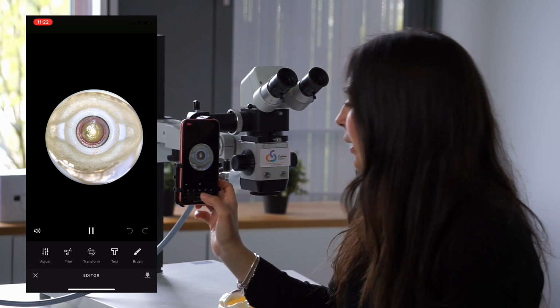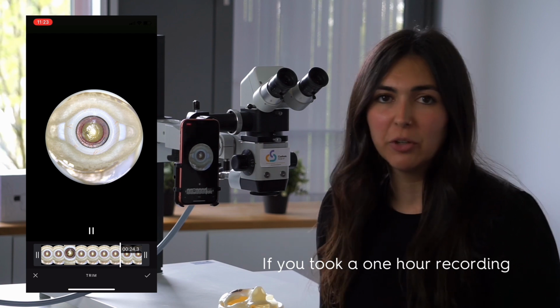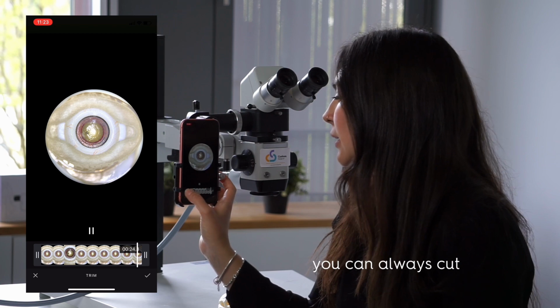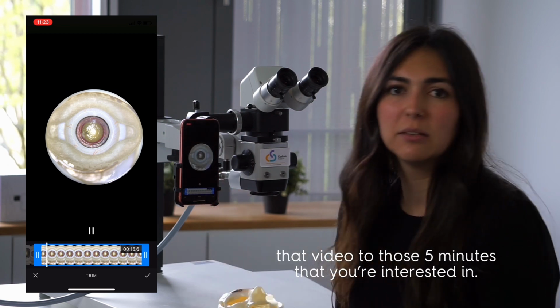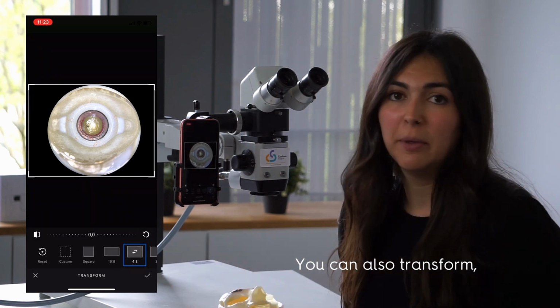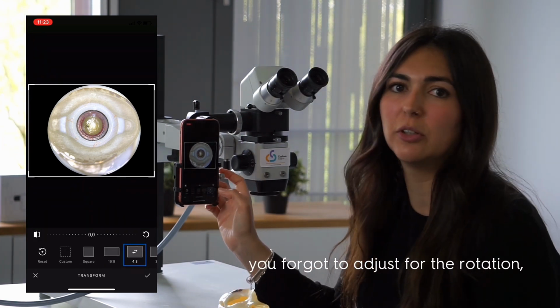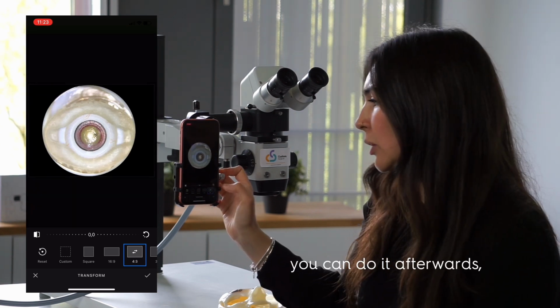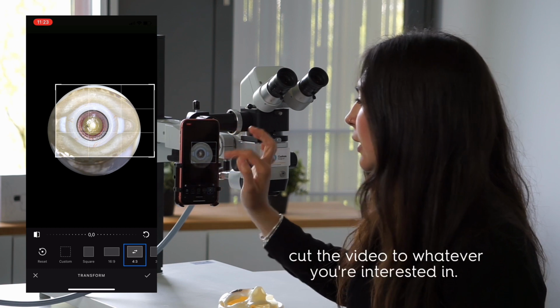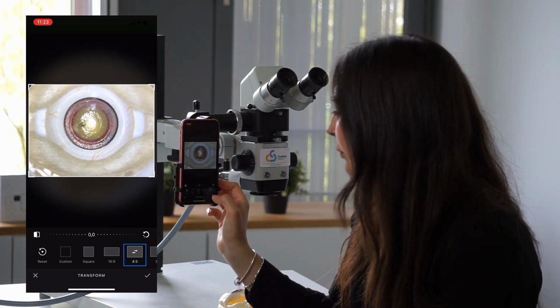The other option is to trim the video. If you took a 1 hour recording and you're only interested in 5 minutes, you can always cut that video to those 5 minutes that you're interested in. You can also transform, crop, and rotate the video. So if for some reason you forgot to adjust for the rotation, you can do it afterwards. That's no problem. And you can also cut the video to whatever you're interested in.